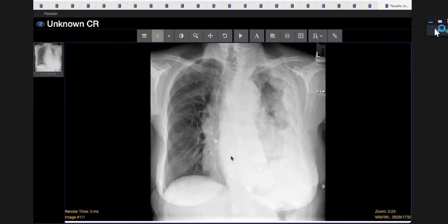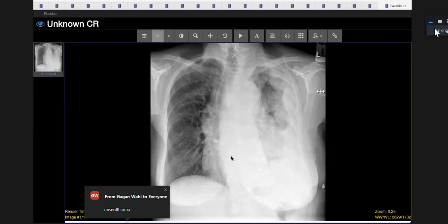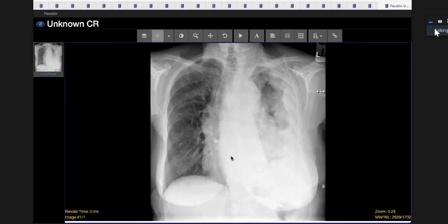And it's unilateral. So this can only be one thing, really. Yeah, mesothelioma. That's right. Now, could breast mets lead to this appearance? You can get pleural mets with breast malignancy, but it would be quite rare to get it quite so unilateral, I would say. This is a very typical pleural encasement of the hemithorax. So your first differential should always be mesothelioma.